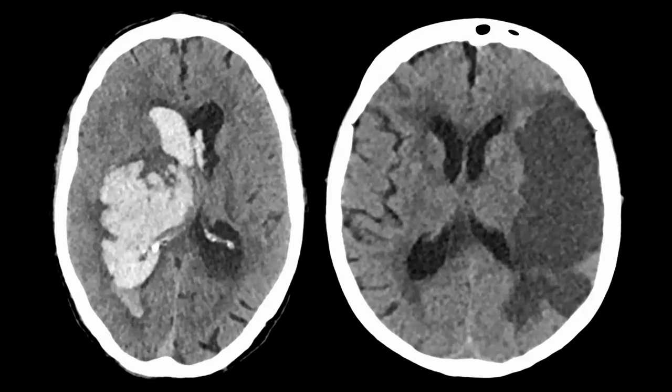Translate this information to pathology. Very basic, an acute hemorrhage is, as said, hyperdense on CT, and is an example of an acute intracranial hemorrhage. And pathology containing lots of water, let's say cerebral edema in an acute ischemic stroke, will be hypodense because it contains a lot of water, and that will decrease the density.